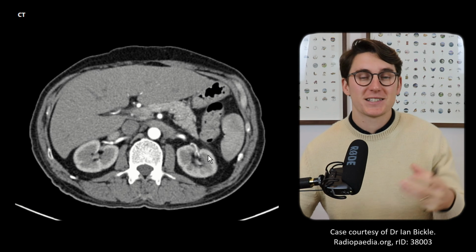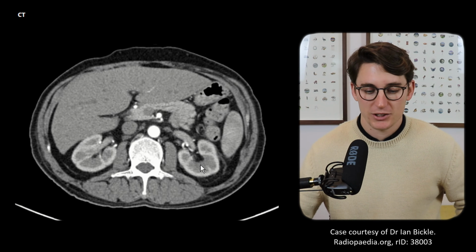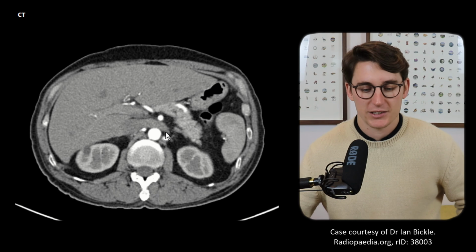And we get venous hypertension in that left kidney. We can get macroscopic or microscopic hematuria and ultimately renal damage, kidney failure. So that's something that we need to look at clinically. Is there enough space allowing for that left renal vein to come through?